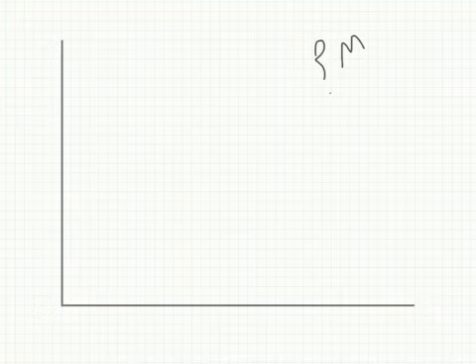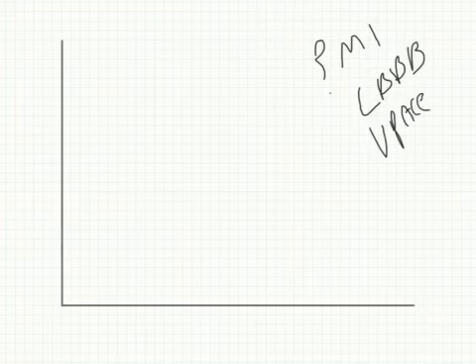Now we know that we have always been taught that you can't identify an MI in a left bundle branch block or a ventricular paced rhythm, and that's because the axis deviation has kind of a false ST elevation that we see. So the Sgarbossa criteria came about to help us try to identify an MI in the presence of that left bundle branch block.